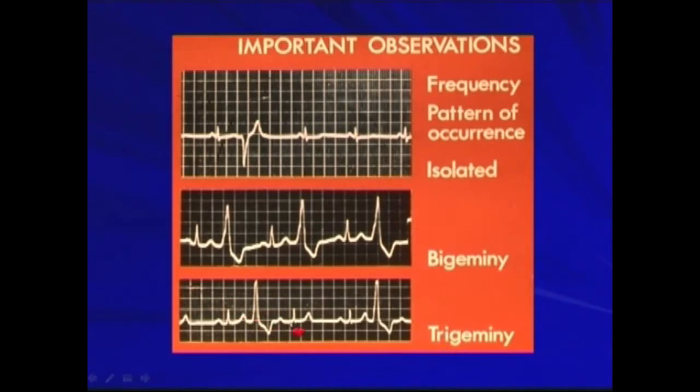And the trigeminy, that is the PVC occur every third beat. So you can see here, this first and second beat is normal. The third beat is a PVC.